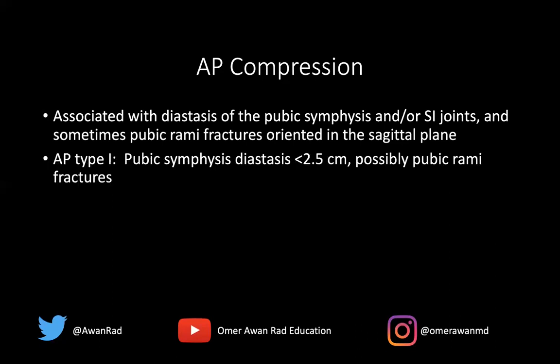There are 3 types of AP compression injuries: type 1, type 2, and type 3. AP type 1 is when the pubic symphysis diastasis is less than 2.5 centimeters. So it's going to be greater than 1 centimeter, but less than 2.5 centimeters. There possibly will be pubic rami fractures, and if present they're going to be oriented vertically or in the sagittal plane. Typically, the sacrospinous and sacrotuberous ligaments are not disrupted.